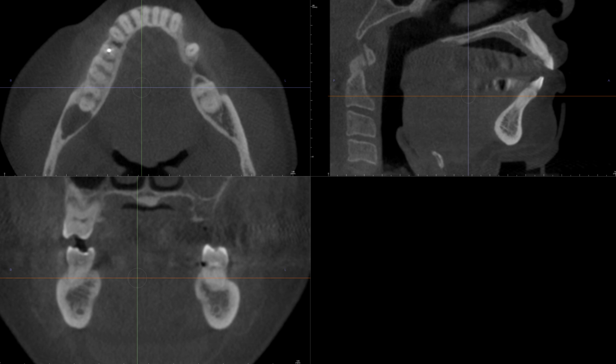This is Dr. Kim. Today I want to go over a biopsy-proven ameloblastoma. You're right, this lesion has been biopsied and is proven to be ameloblastoma, and I would like to go over its radiographic features. The patient is a 62-year-old, and from this axial view you can tell that there is a radiolucent lesion in the posterior right mandible.